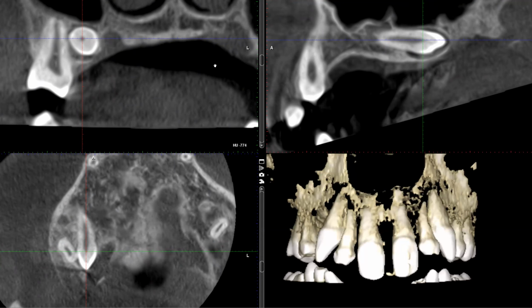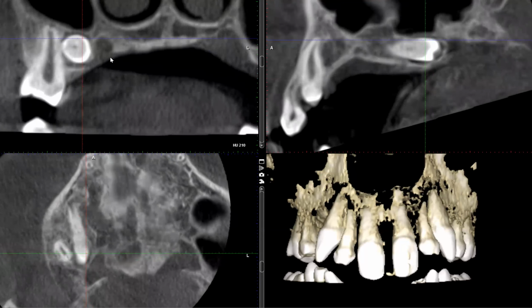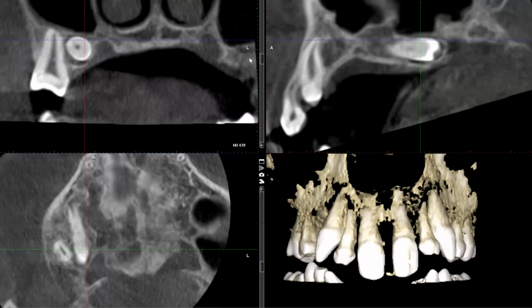When I was a resident, at times when we had this kind of limited field of view with a very severe concavity, I almost sometimes wondered if that's some type of minor salivary cancer that's arising from the palate, and that's certainly a possibility. But from having seen thousands of CBCT scans, just keep that in mind.